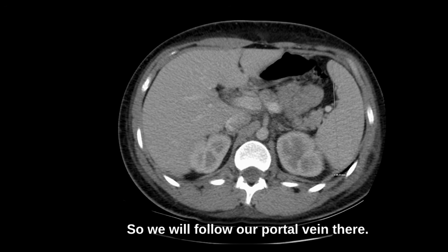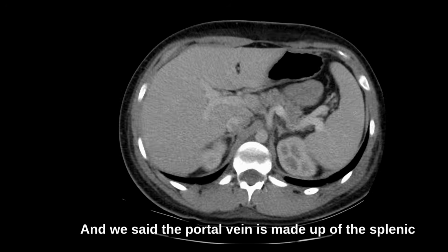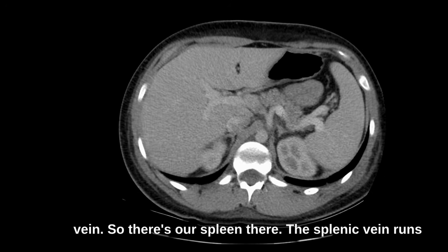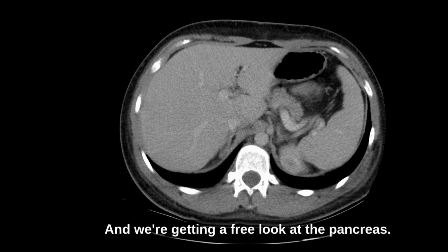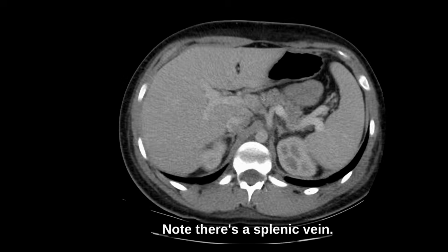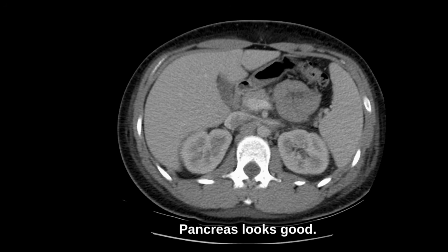Okay, so we will follow our portal vein there. And we said the portal vein is made up of the splenic vein. So there's our spleen there. The splenic vein runs across, and we're getting a free look at the pancreas. Note there's a splenic vein. The pancreas is right in front of it. So that's good. Pancreas looks good.